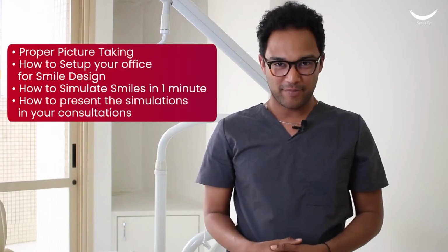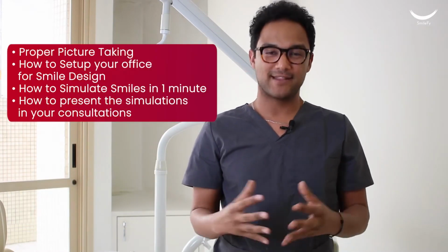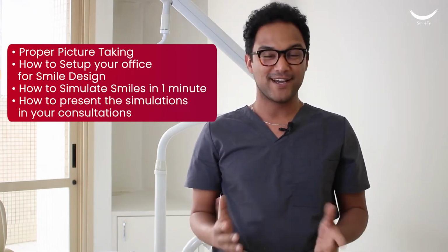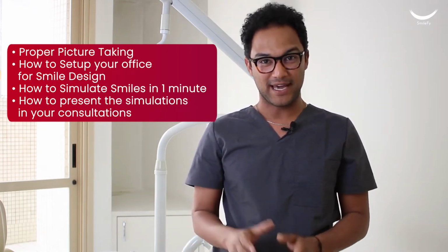Hi, in this video you will learn how to implement smile simulations in your practice. I will teach you how to take the proper picture of a patient, what tools you need to take these pictures, and how to simulate your patient's smiles in just 1 minute using SmileFy software. At the end of the video, you will also be able to present the treatment plan to your patient using this easy-to-use software. So let's get started.